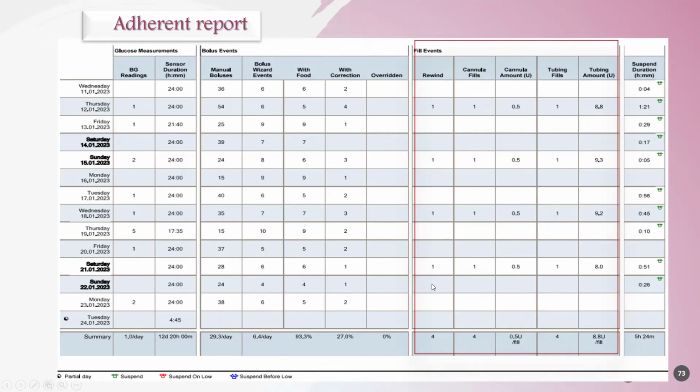Okay. Overall, the gaps came from this time, 3, because they said 3.3. So the gap came here on the last day. He did not change it on Sunday, Monday, Tuesday. Tuesday he should have been changing the infusion set and everything. So this time he didn't change it.